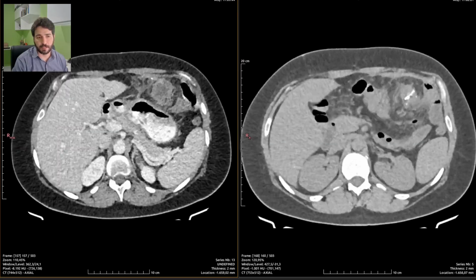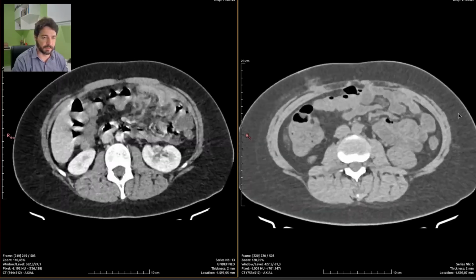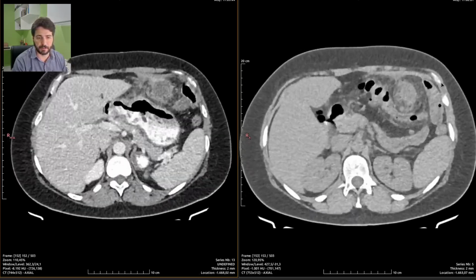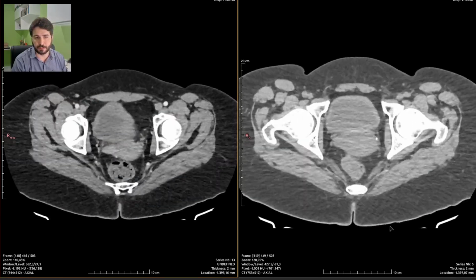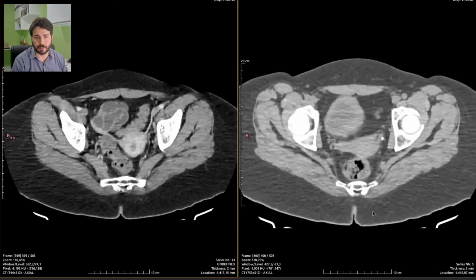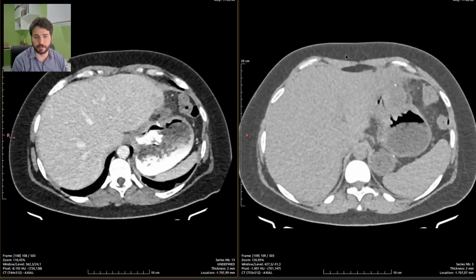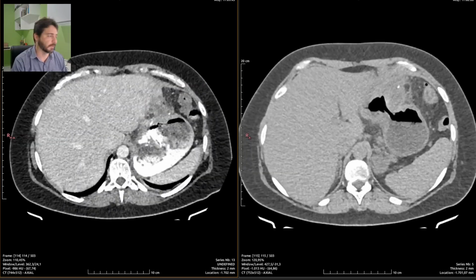So this kind of strategy, this kind of contrast enhancement really isn't of much help. It really doesn't help anyone. It's just a thing that doctors like to order. I really couldn't care less. It doesn't help me in any way. It just makes my life a bit harder. So this is it. This was a pretty uncommon case of post-op abdominal CT scan.